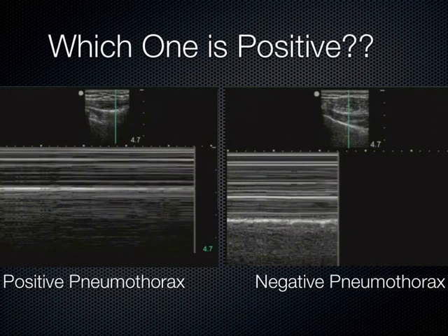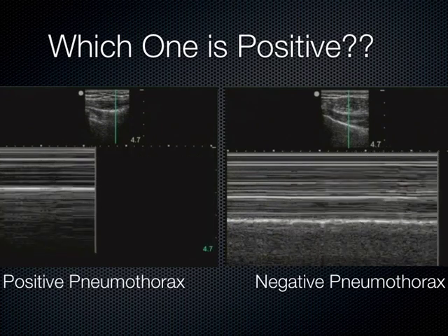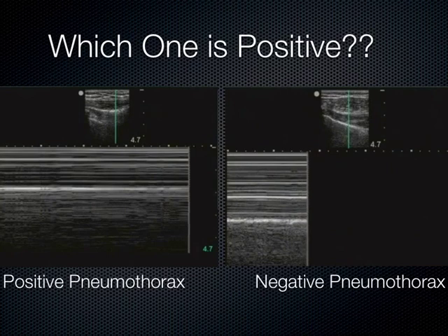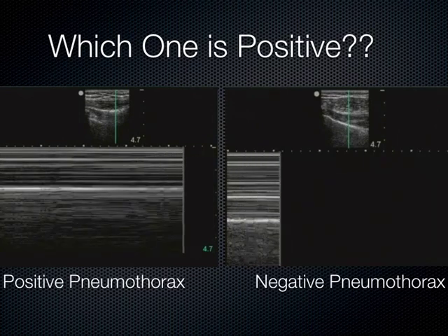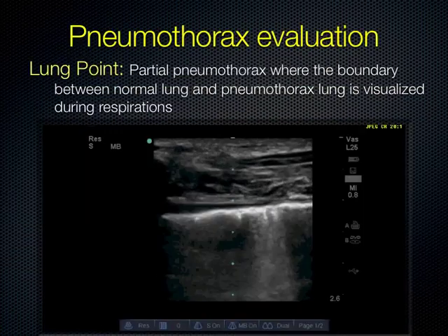Okay. One last thing I'm going to mention that's very specific to pneumothorax, and actually is 100% diagnostic if you see it, although you may go your whole career and never see it. If you do, I want you to understand what it is you're looking at. It's something called a lung point.